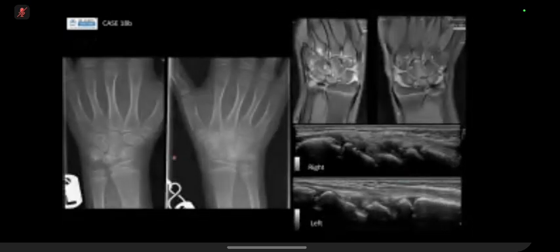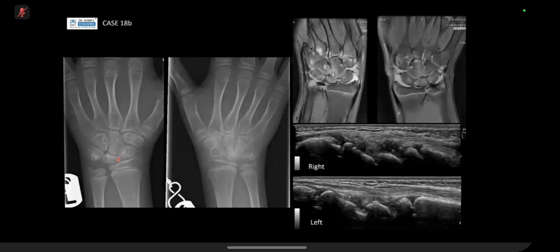On the other X-rays, what you can see here, nicely picked up, is that I guess it takes time to get your eye in, but if you look at quite a few wrist X-rays of the same age, you notice that there will be a bit more joint space between the proximal carpal row. The distal carpal row still looks okay. In the mid carpal row, the space is quite narrowed. It's called a bit of carpal crowding. There's also sclerosis. It just doesn't look very happy in the proximal carpal row.